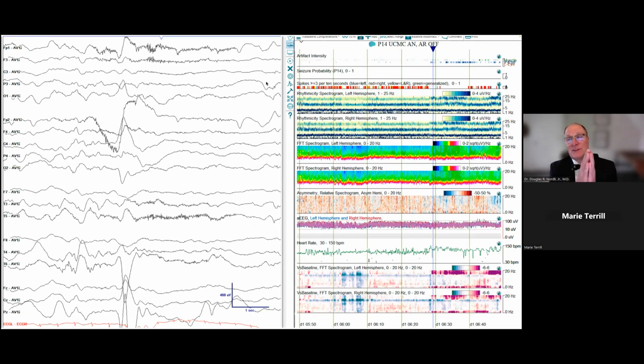How are you going to find these? This, I'm not going to lie to you, is challenging. So you really have to hope that you have good annotations from the technologist and a parent that's nearby to catch everything. Otherwise, you're going to be stuck doing some brute force review if you wanted to characterize every single event. One tip is to use polygraphic activities. So applying a surface EMG, we usually select the right side, approximately 2 centimeters apart. And the paraspinal muscles are very helpful, particularly for this type of seizure. And you can display that concomitant with the EEG, and it's tremendously helpful.